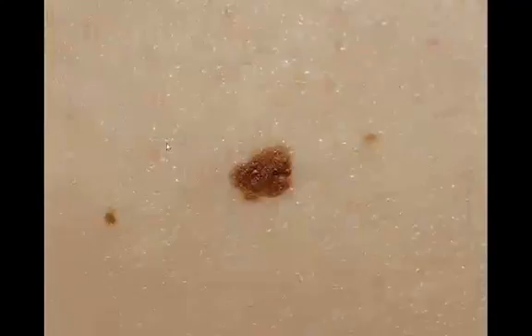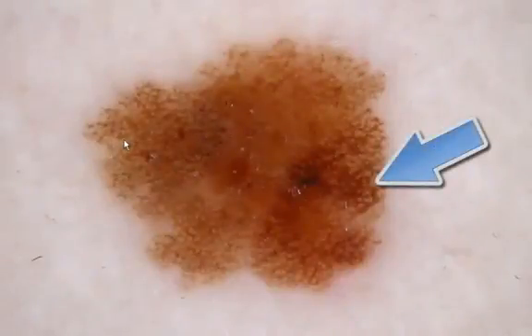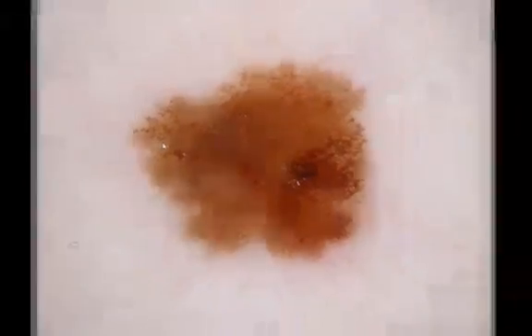Another lesion, clinically, then dermatoscopy. You can see here again radial lines at the periphery. Well, we would call these radial lines radial streaming or irregular streaks if it is a melanoma, and we would call these radial lines maple leaf-like areas or leaf-like areas if it's a BCC. Another example, clinically, dermatoscopy, we can see pigment network lines, and we call them network lines or pigment network if it's a melanocytic lesion only.